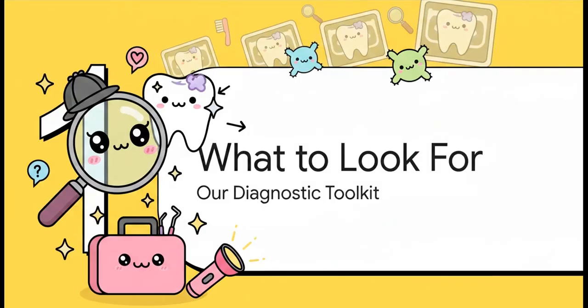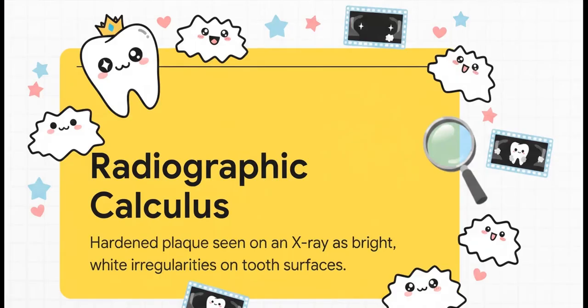Okay, before we can spot any clues, we gotta know what we're looking for, right? Every good detective needs a toolkit, and ours is gonna start with a really clear definition. So what is this stuff? Well, radiographic calculus is basically just plaque that's hardened up so much that it actually shows up on an x-ray. The keywords you need to remember are right there on the screen. Bright white irregularities. We're not looking for anything smooth here.